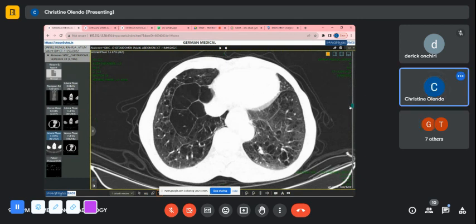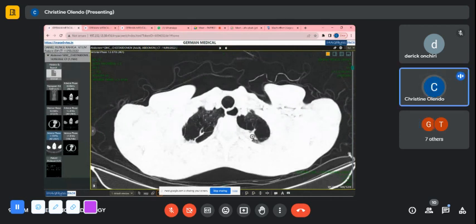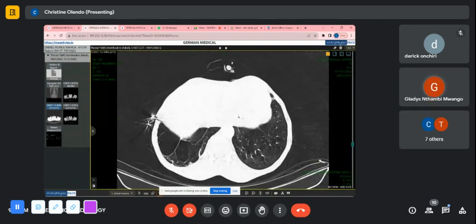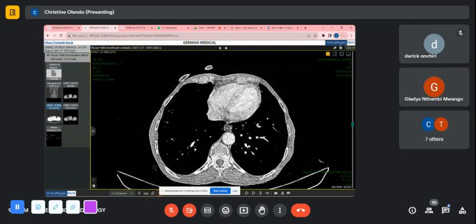No. You continue that. My question was mostly on this apex, at this area. Would this be a mass? Because on all 3 images, they were all there, but it was not reported, so I wasn't so sure. Have you changed the windowing? Can you change the windowing? I put it to soft tissue because you're asking, is that a mass? If it's a mass, yes. The best I can do is the abdomen. That's fine. This one. Yeah.